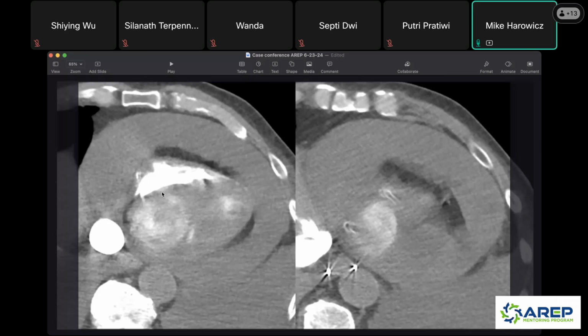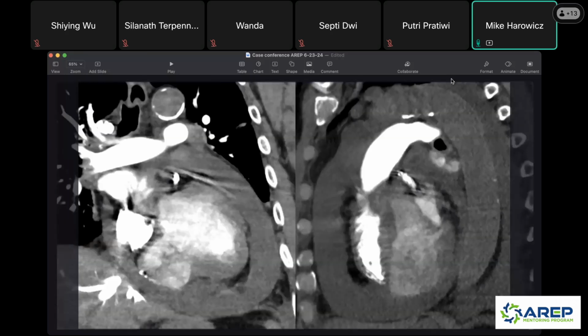But what I'll point out is that when we keep scrolling lower, this is your right ventricle and your left ventricle. This right here is probably the very tip, the very apex of your left ventricle. But what's this really weird ovoid area here that has contrast in it? So to go back to what I said earlier, when the heart looks weird, look at it in different planes. Things will look a lot more obvious in different planes. So here, it's just a coronal on the left and a sagittal on the right. I didn't even do dedicated cardiac planes.